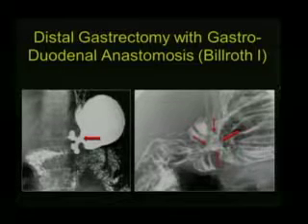Exactly. So one of the differential diagnoses is that this could be a pouch left by the surgeon, but it's extremely rare that they leave something like that. So we perform a double contrast examination of the same patient. Could be, but maybe we can find something that explains all the images. I'll give you a clue.